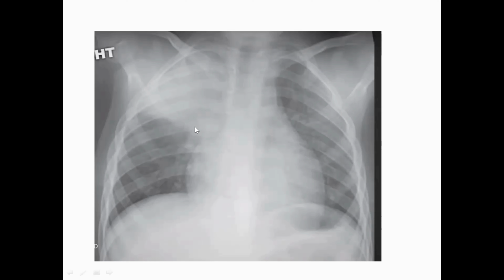This is a fissure, and it obliterates the right upper mediastinum. So this is the way you need to interpret it. The one you are interpreting to will know that this is involving a whole lobe, which is severe. The patient will need IV antibiotics, which is different from only mild consolidation.